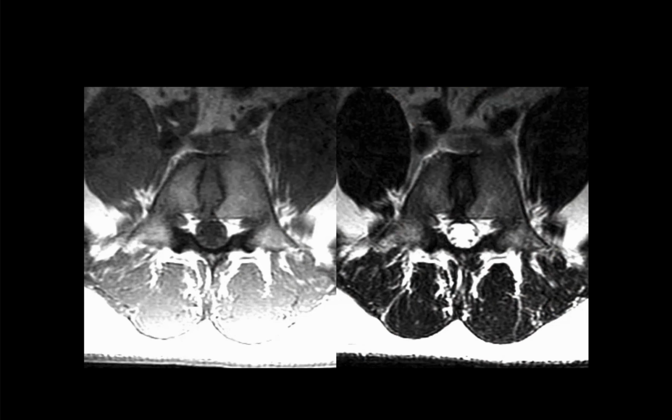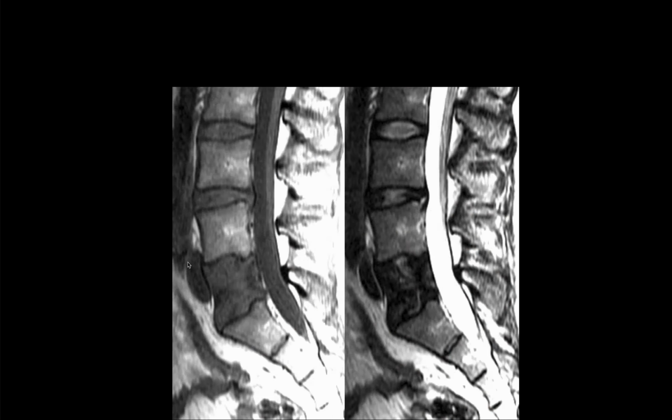Elior? Right, so in this vertebral body, there's this linear low signal on T1 and T2. It looks like a cleft. Yeah, it looks like kind of cartilage, right? Yeah, so this is another cleft, and so this is another butterfly vertebra. And on the sagittal images, this is kind of what it looks like when you go through that cleft.